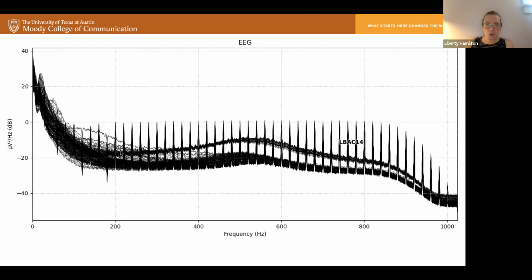And so if you do come across things like that, you may have to think about how to analyze that data differently. You may want to note that as well and potentially not include it in your other blocks. But I think this is something to be aware of as well.